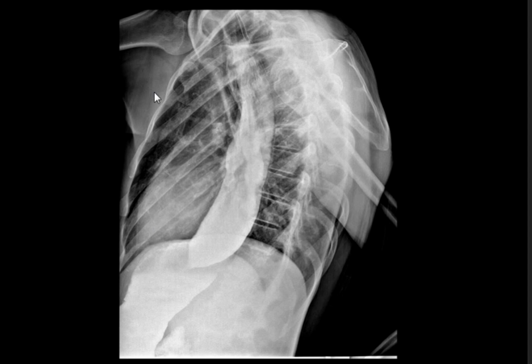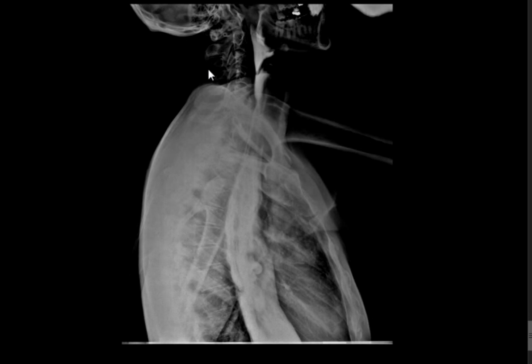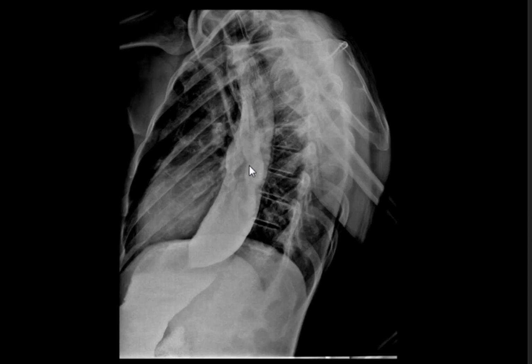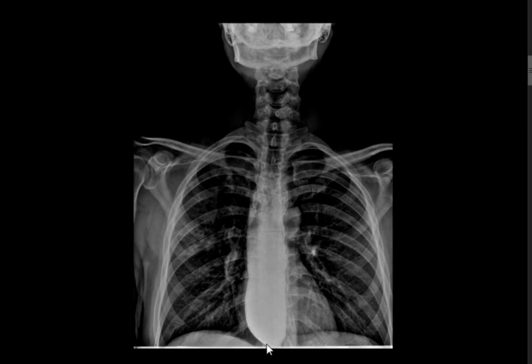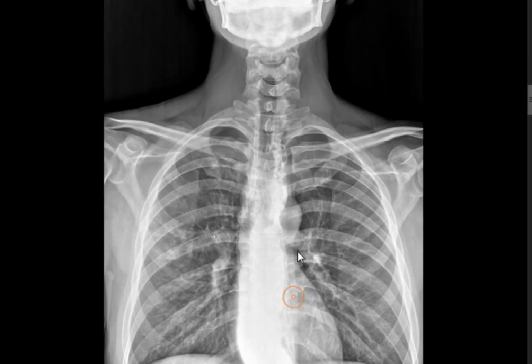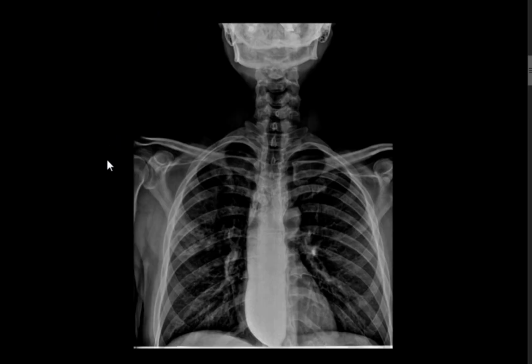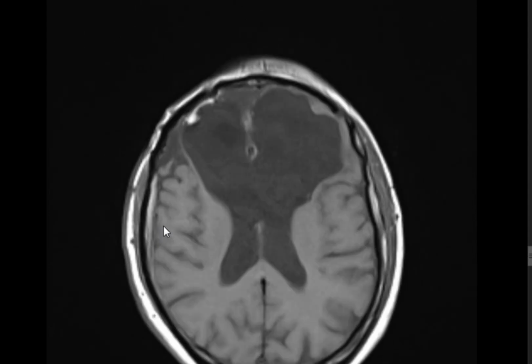And I think if you look carefully, of course, there will be some diverticuli. If you look carefully, you can find some food particles trapped in the esophagus. The thing is that we have a normal esophageal mucosal outline. There is no irregularity to suggest, for example, candidiasis, esophageal varices, or other things that can be seen on a swallow. Okay? It's just primary achalasia.